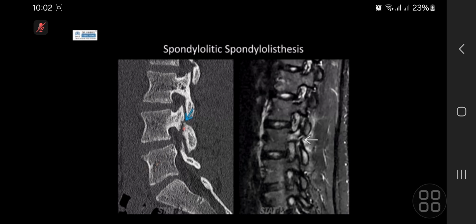Okay, it can be chronic, it can be acute on chronic. Actually, it can be chronic or acute, and on MRI, of course, if it's acute, you see more marrow edema and soft tissue changes. If it's more chronic, because something had happened and things have changed, then you see less of the soft tissue inflammation surrounding it. So often you see it in gymnasts or sports which need a lot of hyperextension, like baseball throwing. Yeah, so pars events.